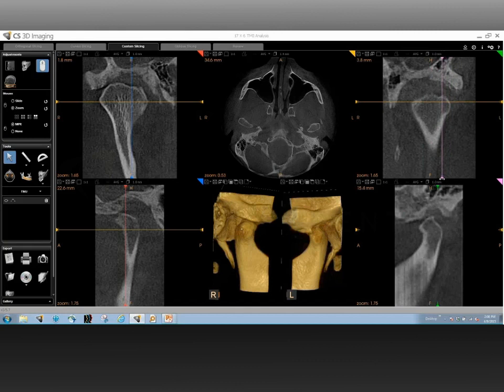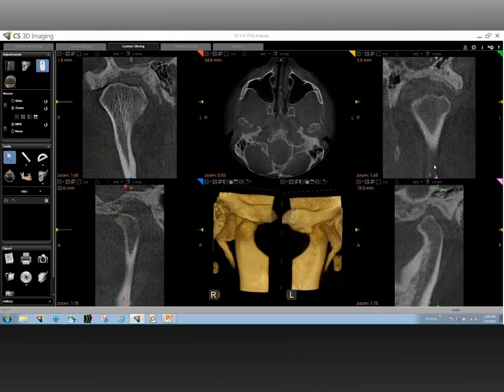And we did notice some sort of an indentation. Remember, I mentioned that? Jordan, let us stop right there and look at that indentation. See that indentation on the head of the condyle, and look at what we see right over here. What we see is quite a bit of change in the remodeling of the condylar head by itself. And then let's go a little bit further medially, and let me just stop over there and give you an idea what we're looking at. Right over here, there's quite a significant amount of flattening on the superior head of the condyle. Now, that clearly is an indication of bone remodeling again.